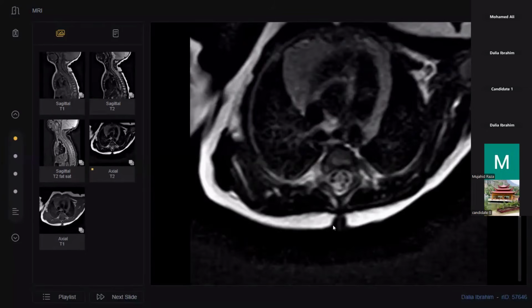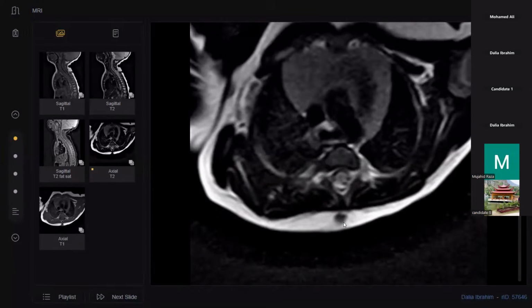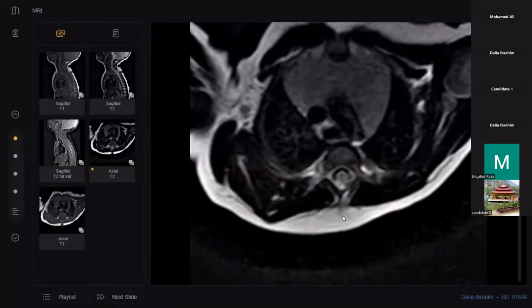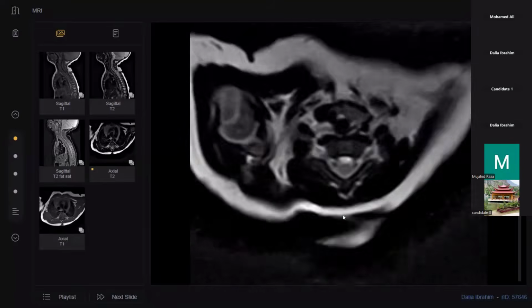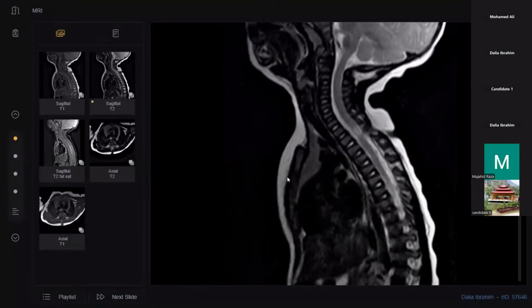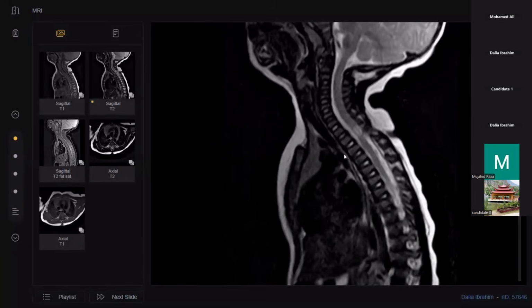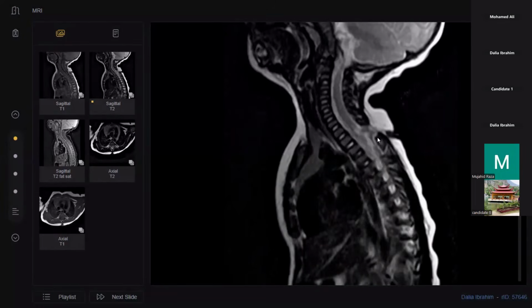This is a region of the skin appendage or the skin tag. In the axial, there is re-demonstration of the spinal dysraphism. Apart from that, I can see herniation of the meninges. Can you see a meningocele or myelomeningocele? There is no definite sac formation, but definitely there is herniation. I am not able to visualize a superadded sac, and the defect on the skin is lined by the skin and the fat.